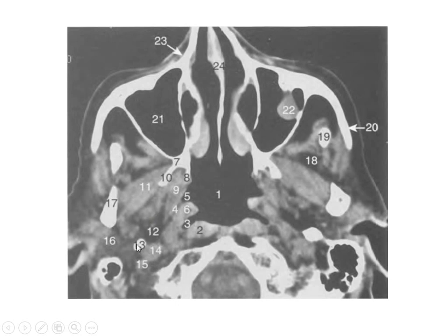This is the Eustachian tube, not the fossa of Rosenmuller. The fossa of Rosenmuller is this, number 3. So you can see the relation between the fossa of Rosenmuller and the parapharyngeal space. They are very close to each other.